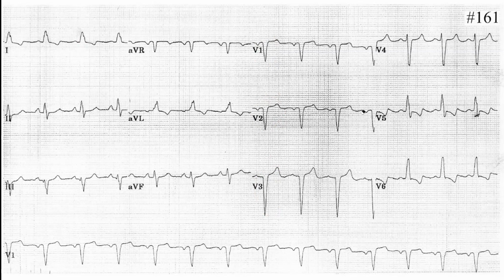So that's a left bundle branch block. And we do have ST depression in V5, V6 and leads 1 and AVL. That is secondary to the left bundle branch block, because the ventricle is activated abnormally, the repolarization is altered. This is why it's called secondary ST-T changes. All right.